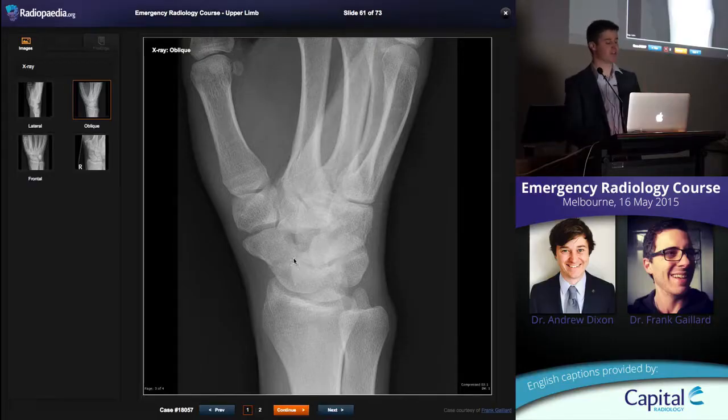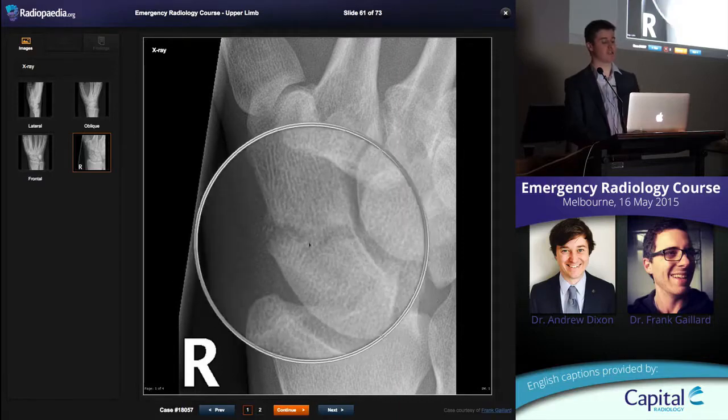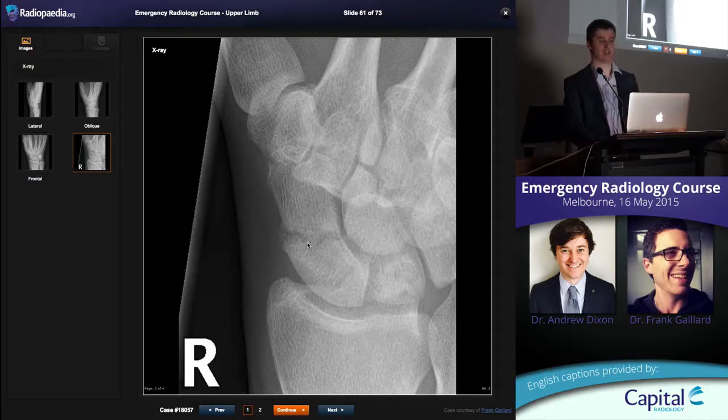So it's important to recognise these fractures and to manage them adequately so that it doesn't become more displaced and result in avascular necrosis. They can be very hard to spot, very subtle scaphoid fractures. You can do focused views if you write scaphoid views. If you write snuff box tenderness or question mark scaphoid fracture on your X-ray request, the radiographers should go on and do these specific scaphoid views, which often give you much finer detail as to the fracture and can give you a better idea as to whether there's a fracture or not.